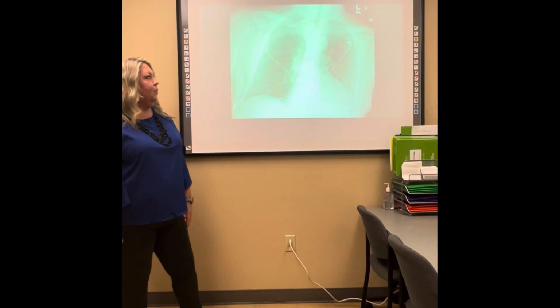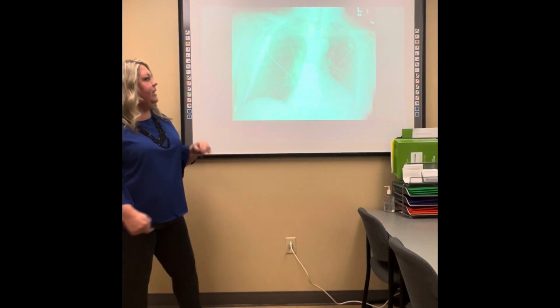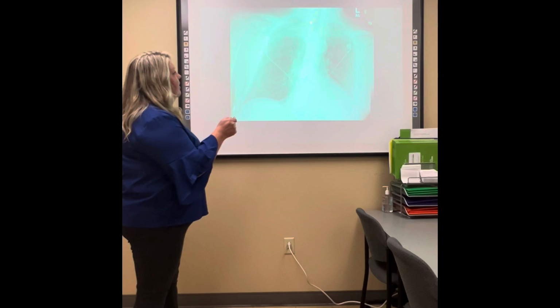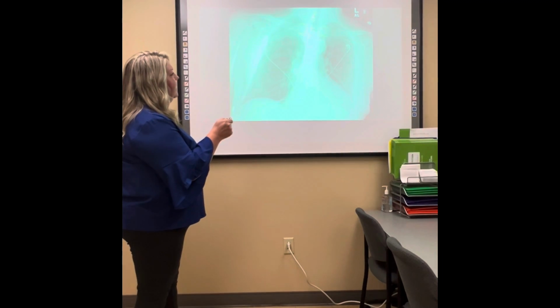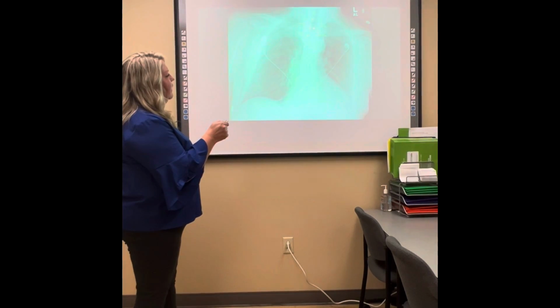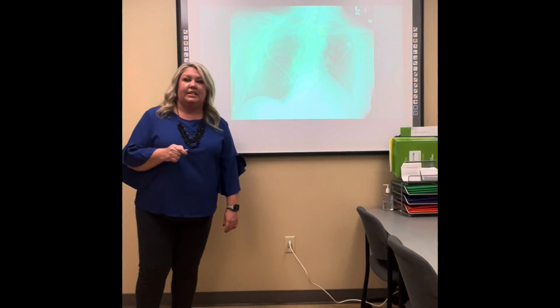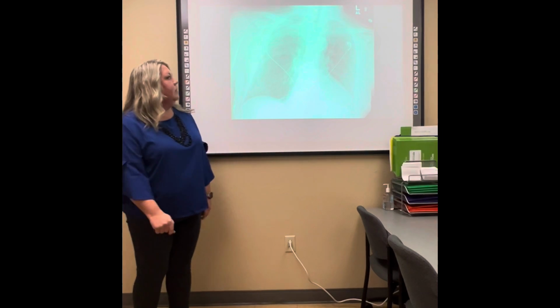So here's an example of where the trachea is not midline to the body. You can see that this patient's rotated because here are the vertebrae, and then this clavicle, sternoclavicular end, the sternal end is greater than the other side. So this patient's rotated, and you can tell they're also tilted one way.